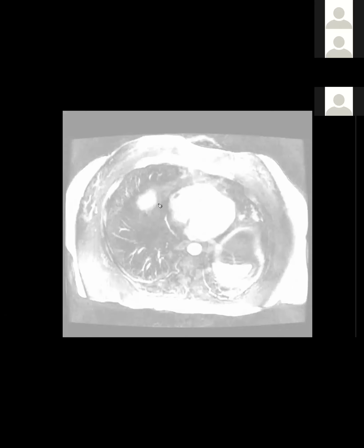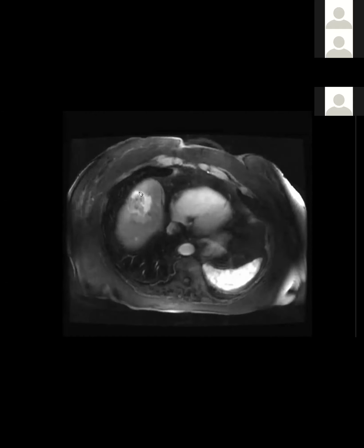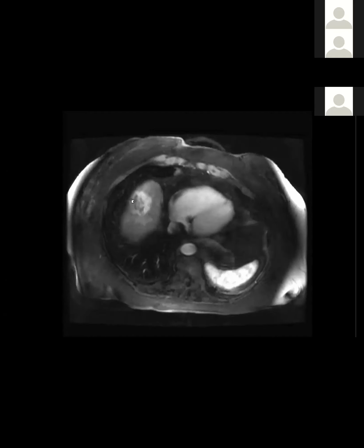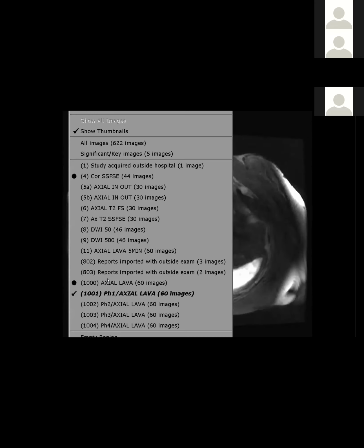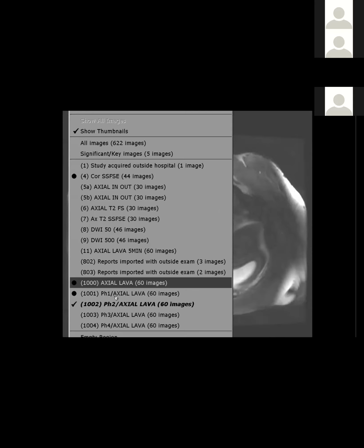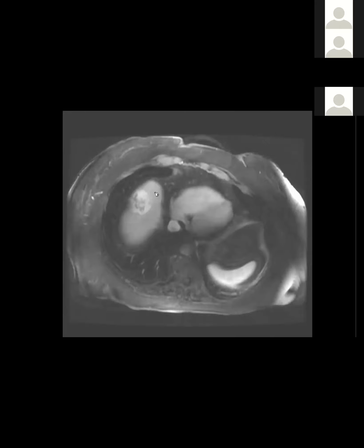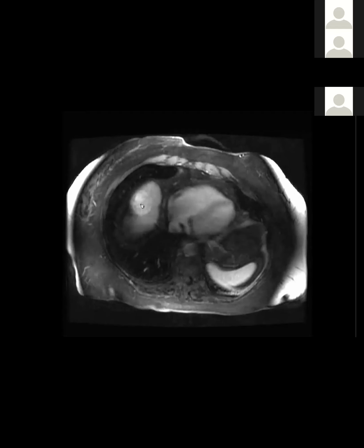Now the enhancement pattern is quite different. You do have kind of nodular peripheral enhancement, but it's contiguous. As Aarti used the word interrupted, that's not happening here. There's no interruption, just a ring of irregular enhancement on arterial phase. As we go further forward, it begins to fill in more, but the center is still very heterogeneous, although it does enhance more and more in the delayed images.